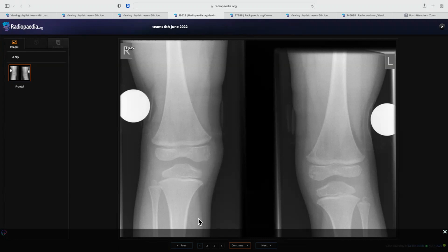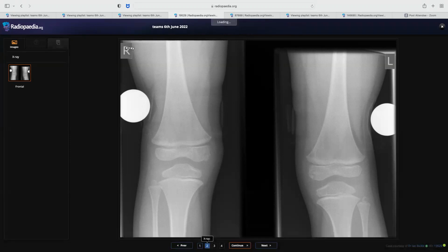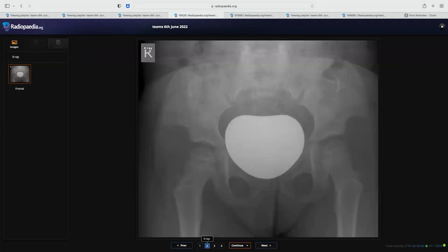Okay, there are some other X-rays also. I'll show you those, of the same patient. I'm given an X-ray of the pelvic bones, and I think there is a horizontal acetabular roof in this, and there is flaring of the bilateral iliac bones.